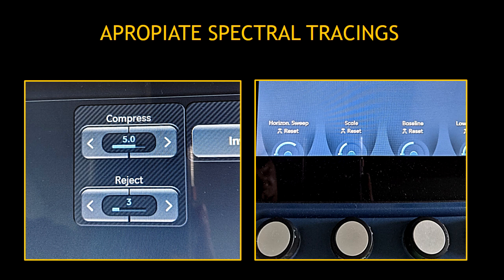You can find these optimization tools on every echo machine. These features are made to optimize continuous wave Doppler signals, pulse wave Doppler signals, and color flow Doppler signals.